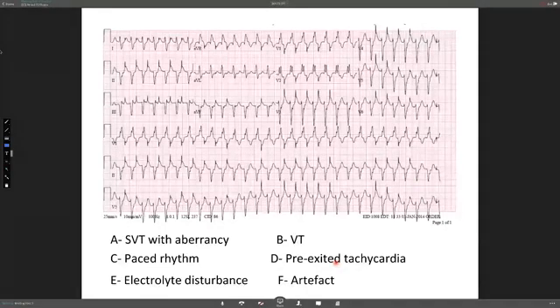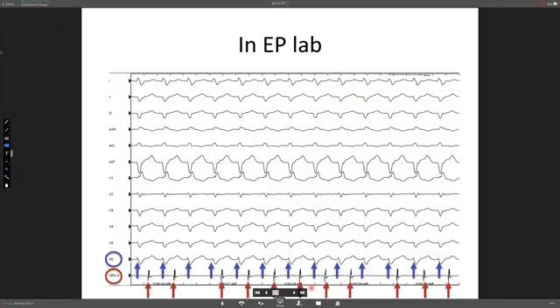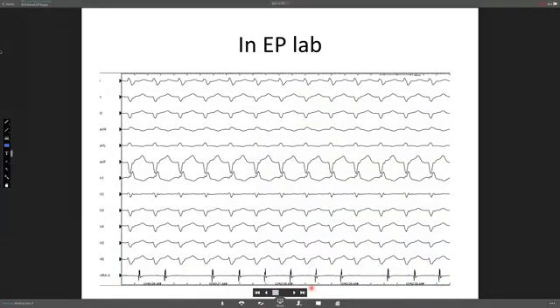The second comment I have, Khalid, is about the intracardiac EGM. Can you bring that slide up? I think it's very interesting. Very nice case, by the way. I love it. Yeah, this one here. Yes. Or this one, actually. This one is good. This one is perfect. So here, let me just make a comment, because this is beautiful.